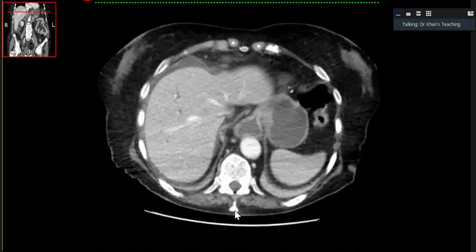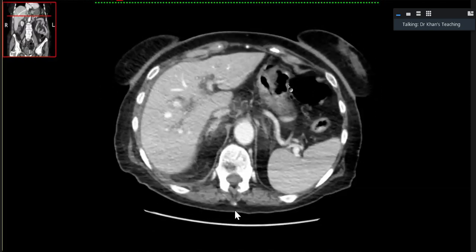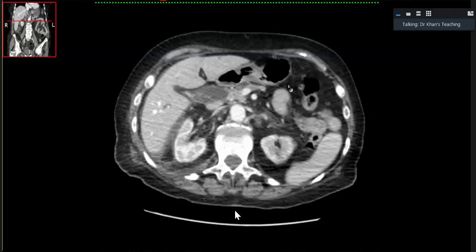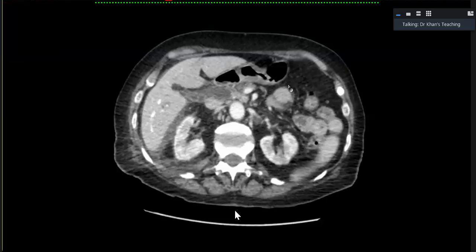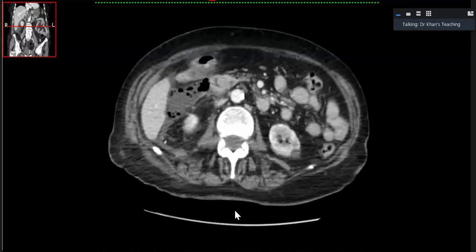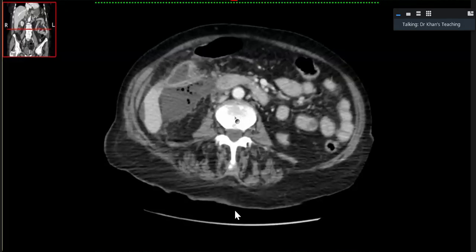So this is a fine touch case. Now, first of all, candidate 4, you should have asked for a lung window for the air, isn't it? In any case, I think you just saw it and you did not ask for it.